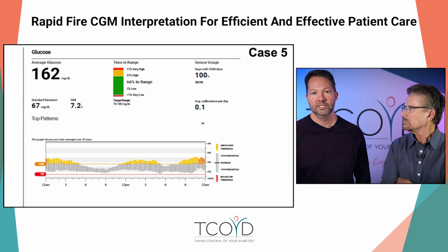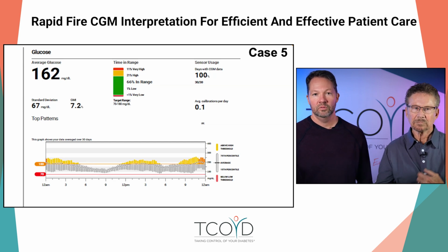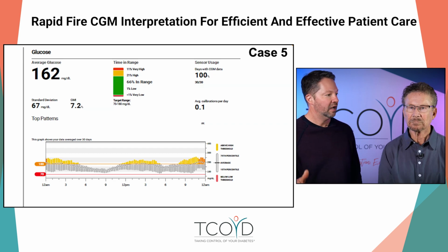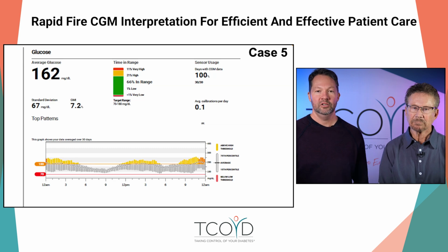The time in range is 66%, again, right there at 70%. And great that they really don't have that many lows. And I always say, it doesn't mean they don't have lows. They can have a bad low and then recover, but it's not a constant, continuous problem.